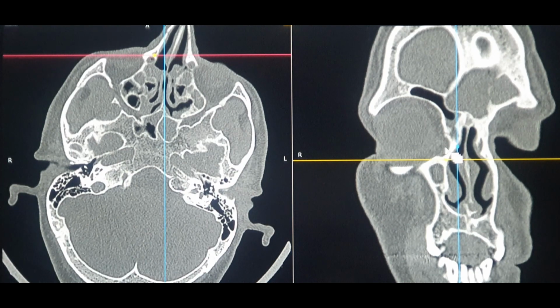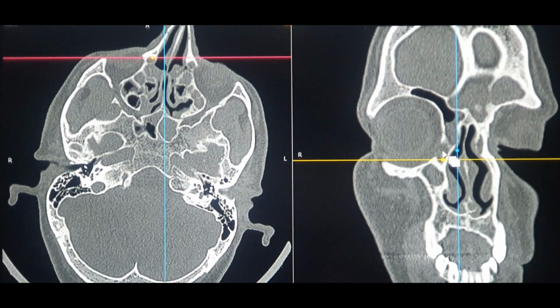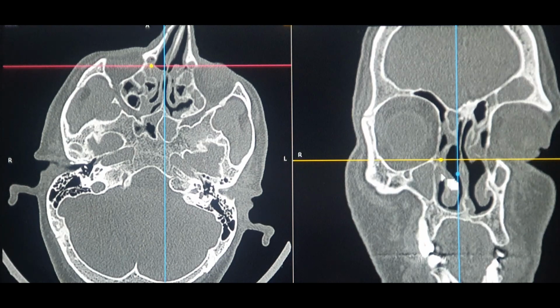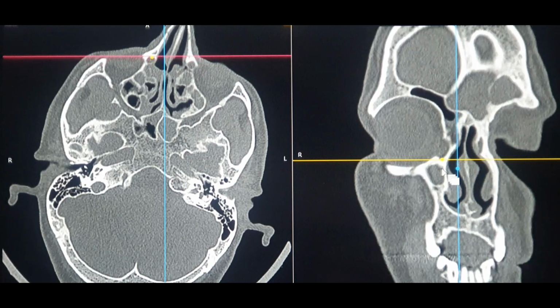which is kind of opacified with grayish matter. So that happens to be the nasolacrimal duct, and you can keep following the nasolacrimal duct posteriorly. You can actually see that opening in the inferior meatus. So that's very easy to understand. And now that's the area.